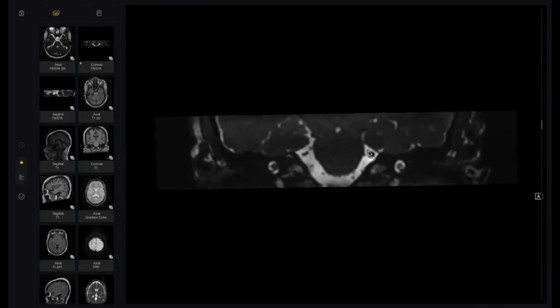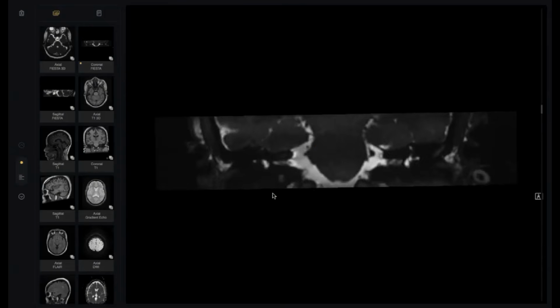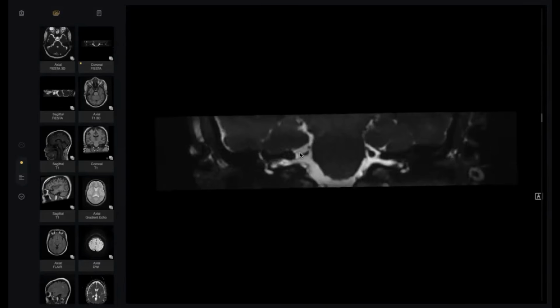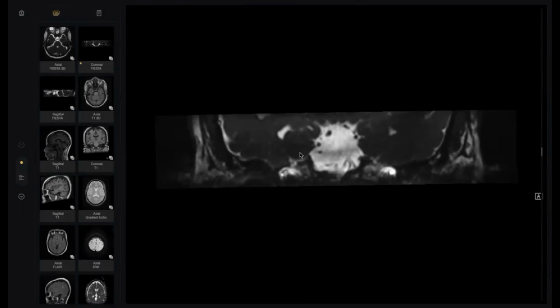There is a structure here and a structure here, and I'm searching for trigeminal abnormality. So there is asymmetry. Try to guess. This is a trigeminal but atrophied. This is a good trigeminal. What is this here? Something above here and not here. Follow it, please. Follow this structure. Look. It is curvilinear. And if you follow again and again, look.